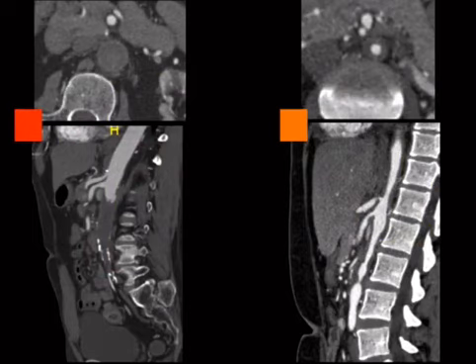So here are two different pathologies involving iliac occlusion or near occlusion. The one in red is totally out, and the one in orange is nearly out in places, but this same pathology could actually cause full-on occlusion. Now, you would say, how do I tell these apart? If you're asked to tell them apart, or you're shown this case and both are on the differential, this is the strategy I would use.